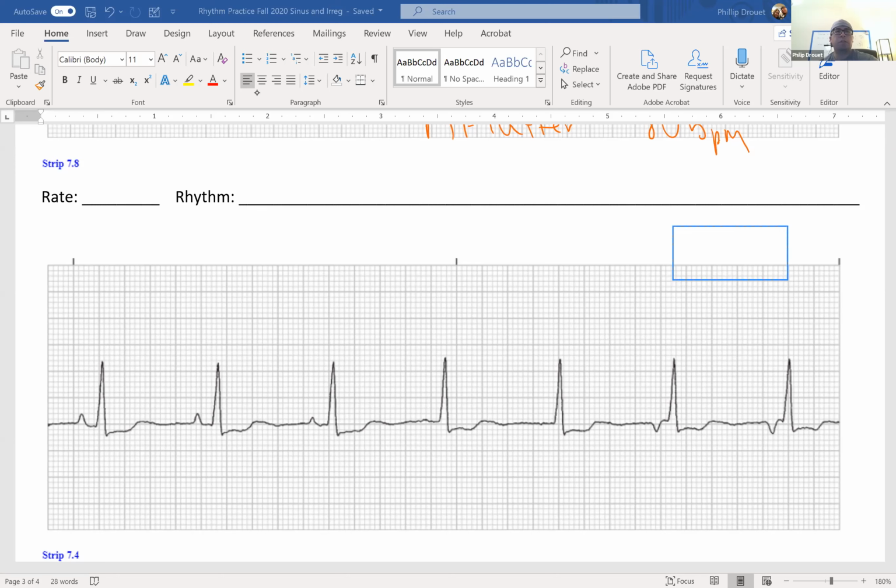All right, so let's take a look at this first one. That P wave looks like that P wave. This one is different. This one is different. All right, so whenever we have different P waves, we call it P prime, right? So that's P prime. I'm going to call it P prime 1. This one's P prime 2 because that does not look like that one.